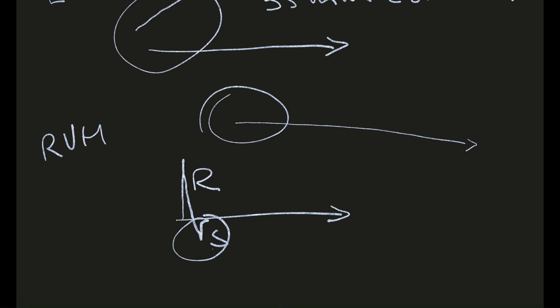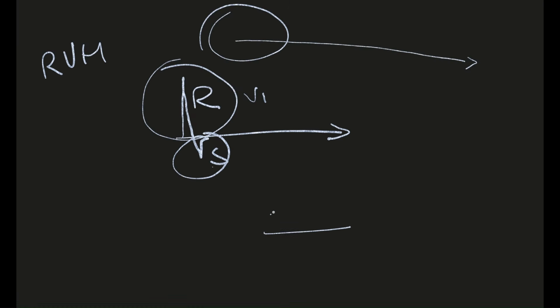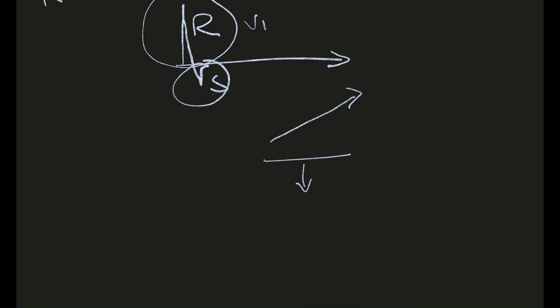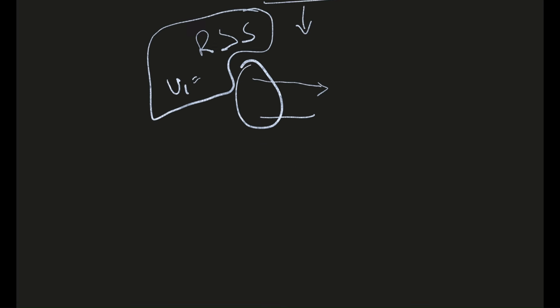The biggest R wave you may find will be in V1. The pattern would have changed from normal, this pattern, towards this pattern in RVH. The point is, in V1 you will always find the R wave bigger than the S wave. It will be the single most important indication that the patient might have right ventricular hypertrophy.